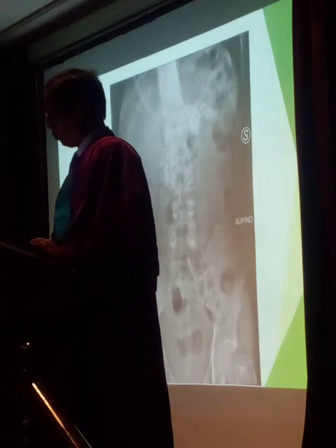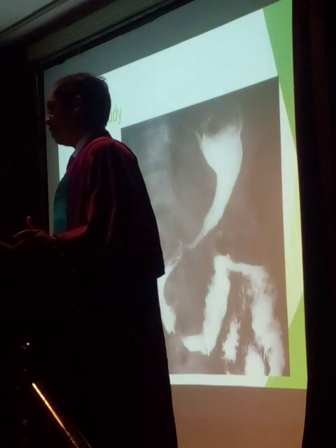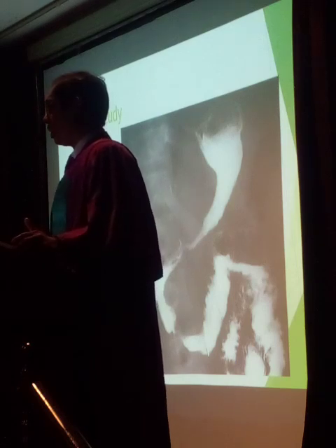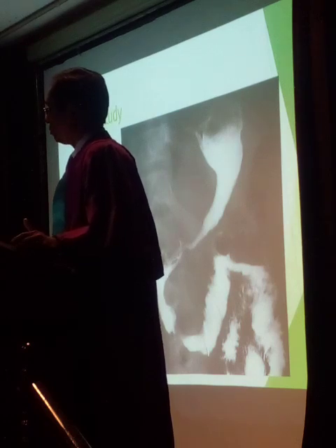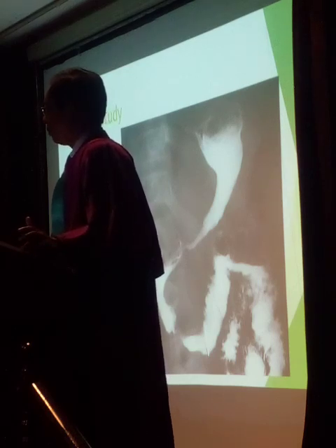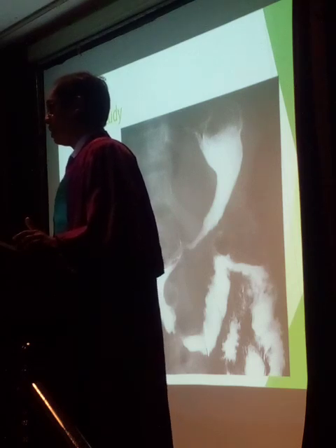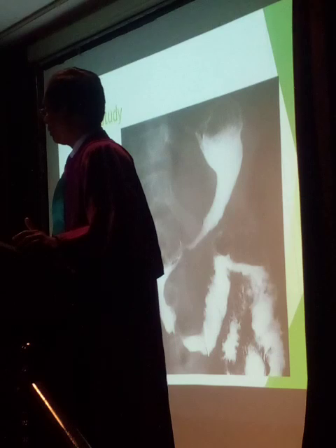The next one is the barium study, which we don't use nowadays, but we used it previously to detect and assess dysphagia. In a dysphagic patient, we do this barium meal and follow through. In those studies, we can see narrowing at the second part of the duodenum, which is at the pancreatic head.